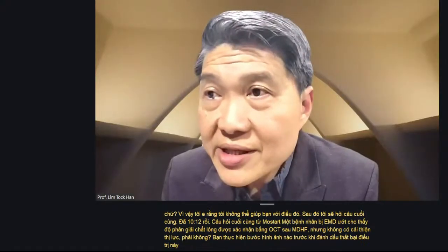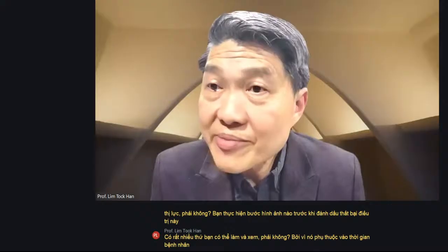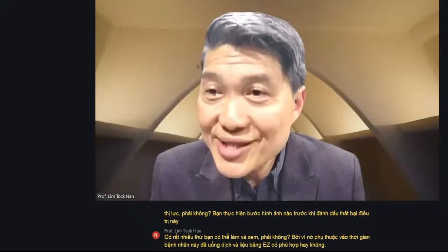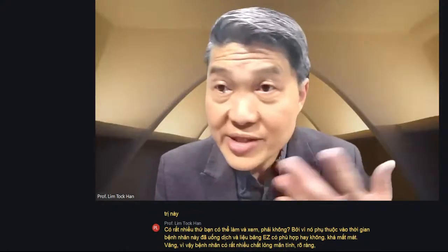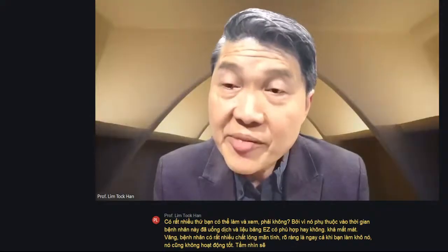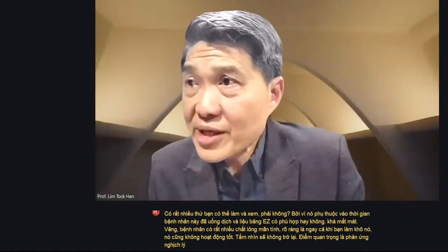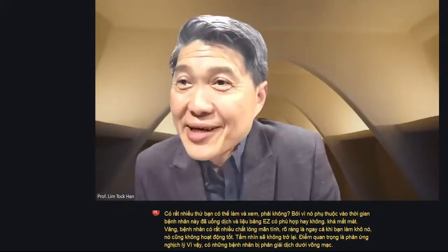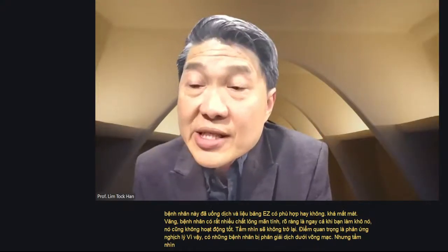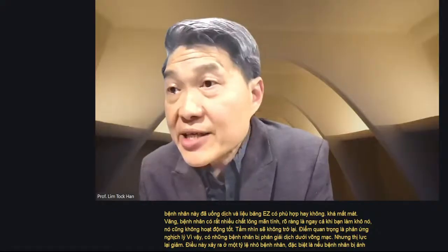Okay, so there are various things that you can do and see. Of course, it depends on how long this patient had fluid and whether the EZ band is already lost. If the patient had very chronic fluid, even if you dry it up, the vision doesn't come back. The important point is paradoxical response. There are patients with subretinal fluid resolution, and yet vision drops. It occurs in a small percentage of patients, especially if the patient has had the condition for many years.